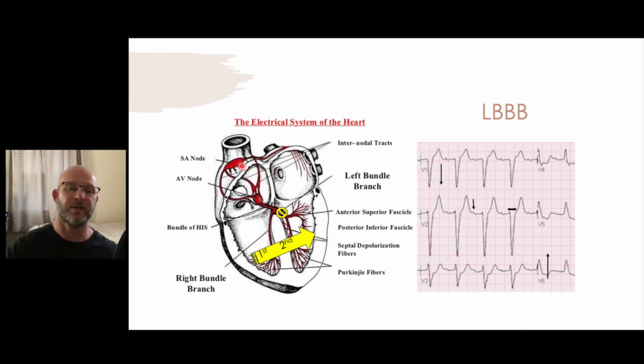This is interesting because we have a wide PR interval, because the signal up here is taking longer than it should to make it through the atria. And now when we get to the ventricles, we're wide once again. But we know we're on the wire because we have that P wave. The signal tries to go down the left, it can't, so it comes down the right, and it goes across from cell wall to cell wall to cell wall. That adds time.